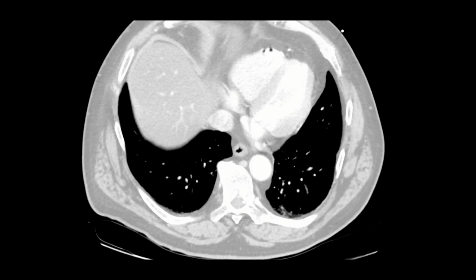These patients that become symptomatic from an air embolism might get acutely short of breath right on your CT table. It usually happens right afterwards. And you don't really know for sure if the patient is short of breath right after you give contrast: are they having an allergic reaction, or was there an air embolism? Hopefully if somebody is monitoring the injection, you might actually see the air going in and be like, oh, damn it, and hit the stop button. If you don't, hopefully you're looking at the images as they're coming out, and you can see it in the heart.